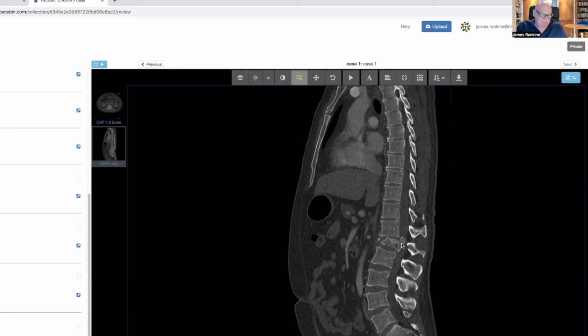And just like any other ring structure, like the pelvis and lots of other areas in the body, if you break it at one point, here in the vertebral body exploding outwards, it also gets disrupted at the back. So this is an example of a true axial compressive force coming straight down through the spine, the sort of thing that if a patient jumped off a motorway bridge, for instance, they could sustain this sort of injury.